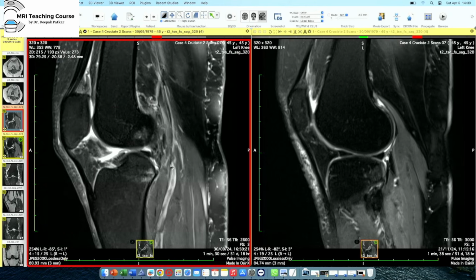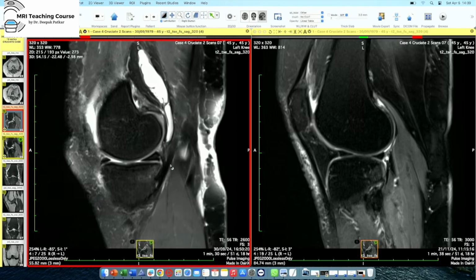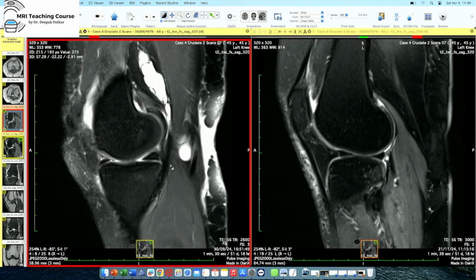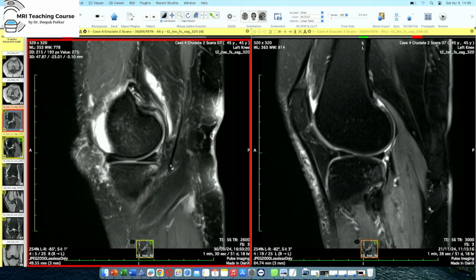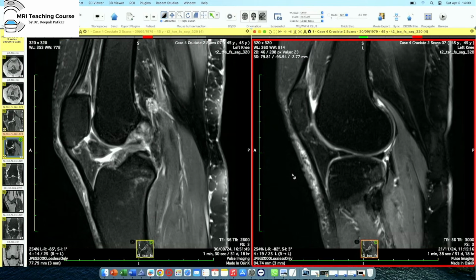So seeing this, now I want all of you to tell me what is there. Sorry, A or P? Okay. So you also have the pivot shift edema pattern. And obviously there is a nice ACL injury. Usually when it's an acute stage, the orthopods will not immediately operate. The patient will rest for 4 to 6 weeks. If still there is Lachman instability and the patient wants to, he'll repeat the scan.